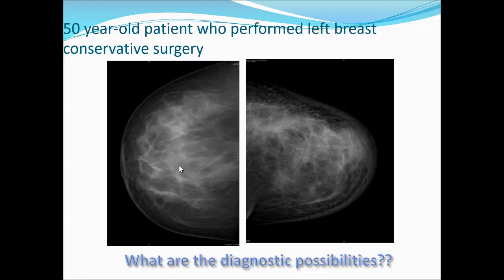This is a case of a female patient with left conservative breast surgery. If I put these films and I didn't say the history in this case, could you pick? Yes. There is a small size of this breast compared to the other. There is diffuse skin thickening, and the skin thickening and edema in the post-therapeutic breast can be found even all the time after.